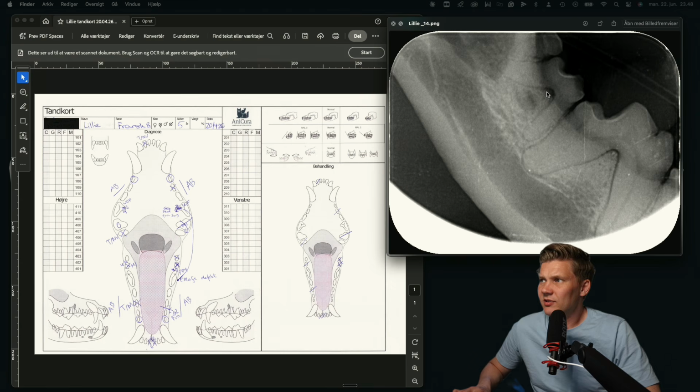This seems like there is some darkened area here, so there is some bone loss in the furcation area, as well as some widened periodontal ligament space. So as you notice that right here, the periodontal ligament, which is that black line, becomes wider and wider. It's more broad here than down here. So you have some widening of the periodontal ligament, and this resulted in some mobility.